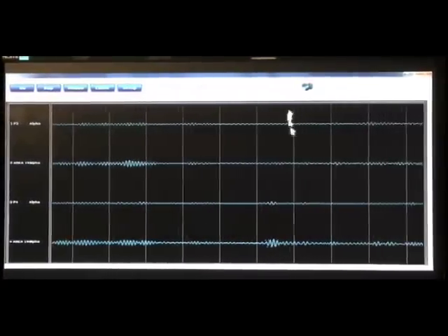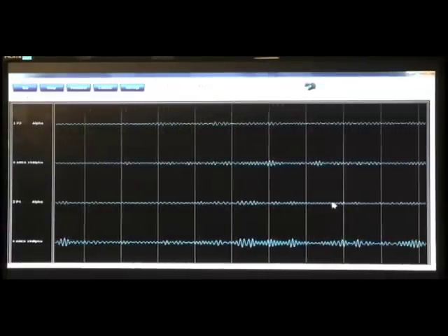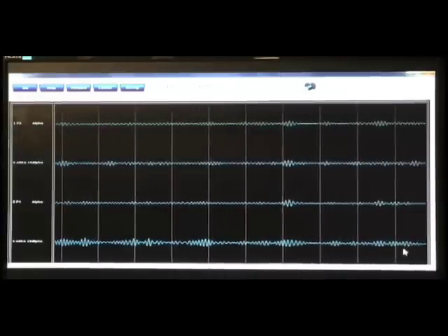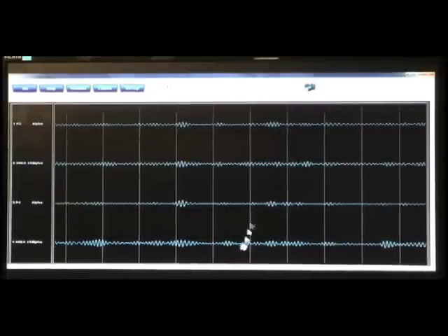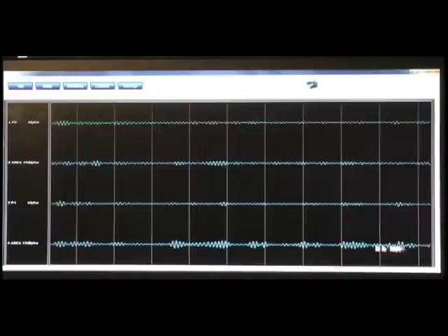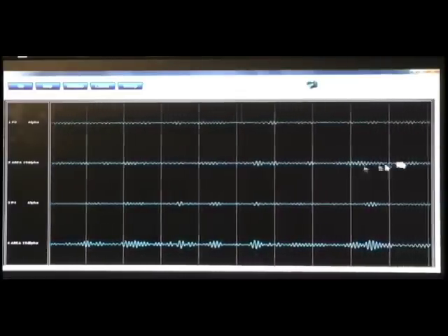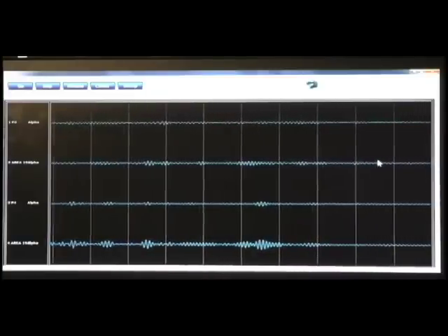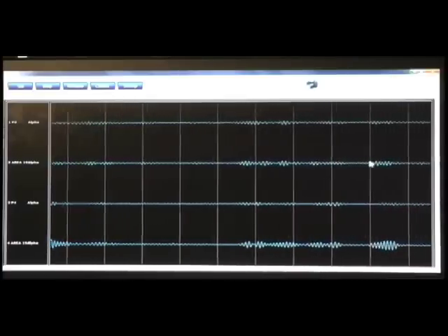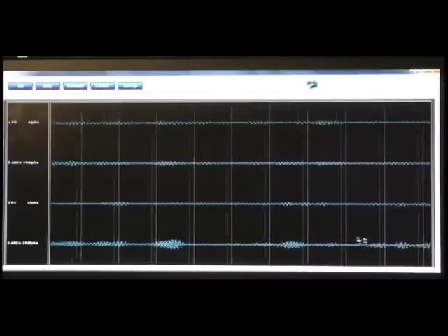P3 and P4, being surface channels, are commingled with a lot of other spread information, and the Brodmann channels, channels 2 and 4, are much more specific. So they're drawing data directly from the involved regions of the brain, and now we see much more clearly that we have this specific activity on area 19 on the right, which is much more pronounced from the activity on the left, area 19 on the left. So this shows that using Brodmann channels to separate brain activity can give you more specific information, better resolution in time as well as in space compared to surface training.